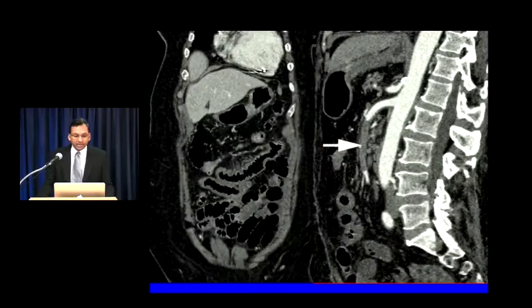So here's another case, again, that shows you that there's a lot of ambiguity here, right? Big SMA embolus, and in this case, some of these bowel loops are non-enhancing, but there is some degree of bowel wall thickening. So again, every case doesn't necessarily always follow the rules.